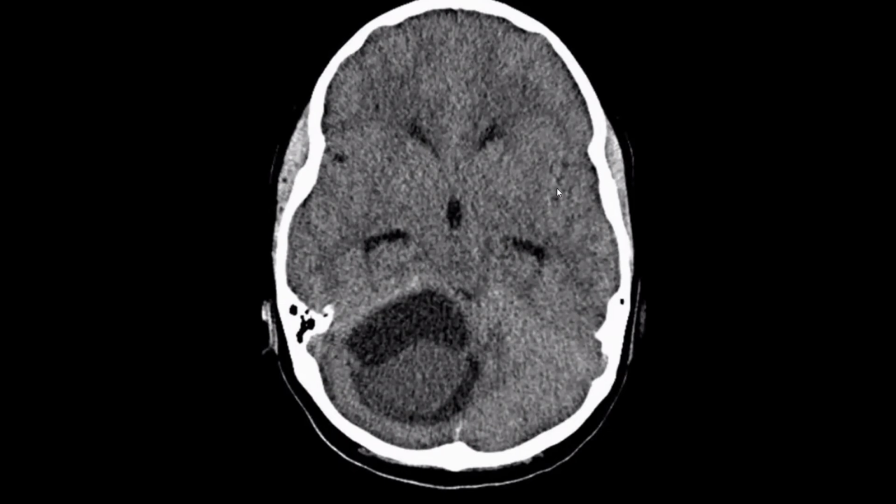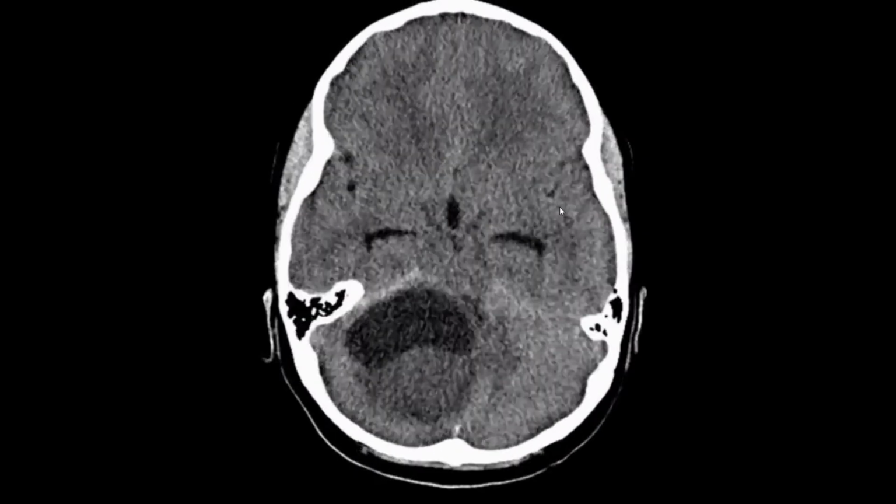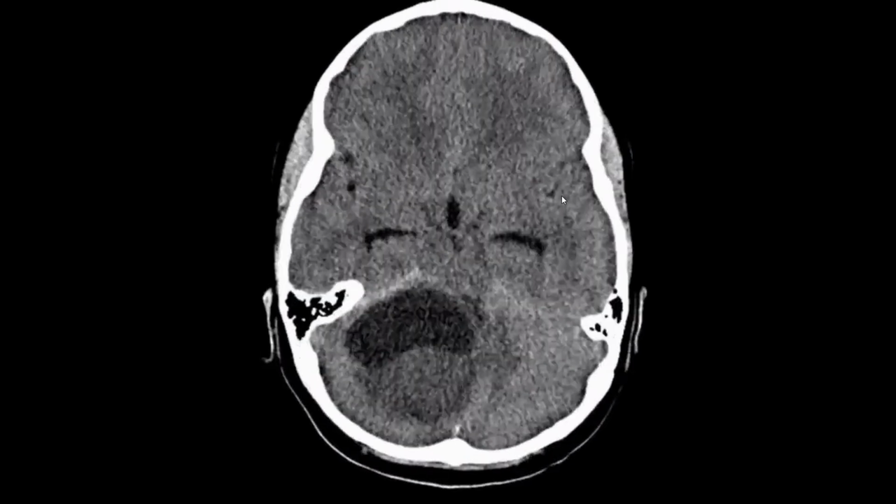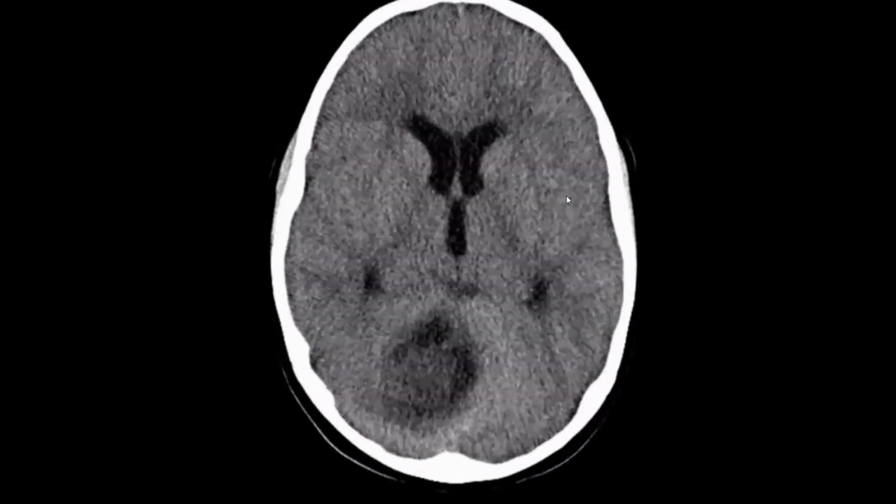So we have here the right cerebellar hemisphere. If I want to describe this mass lesion, I will say the right cerebellar hemisphere is the seat of a well-circumscribed complex space occupying lesion of mixed cystic and solid components. We should describe the mass effect, compressing the brainstem anteriorly and compressing and displacing the fourth ventricle to the left side.